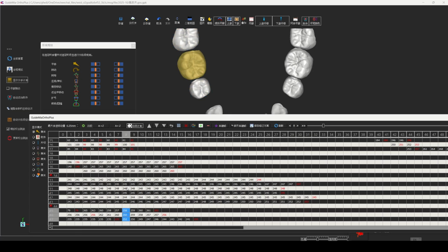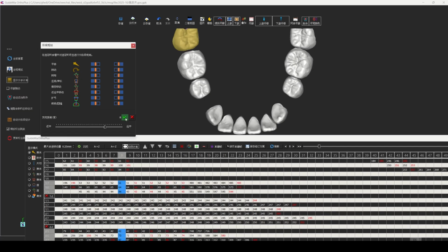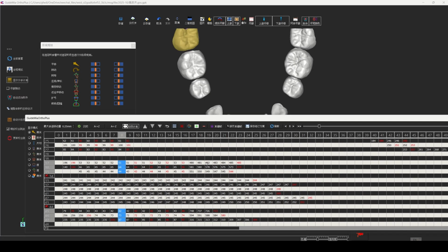We are double clicking those points to check what the alignment looks like. In those steps we find, roughly at step 8, we want to do angulation, pre-angulation of those teeth. So we do expansion first, we do pre-angulation, and the step movements after pre-angulation could be too big, but we decided to do a rotation first. In this case, we use that rotation first button.